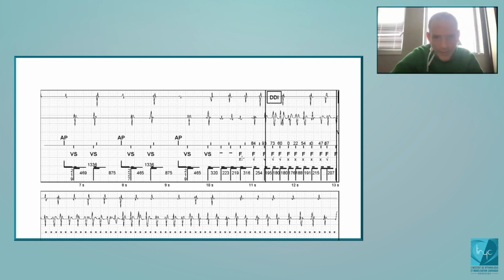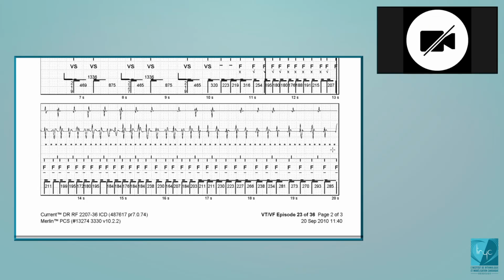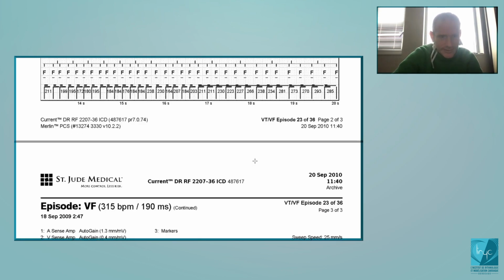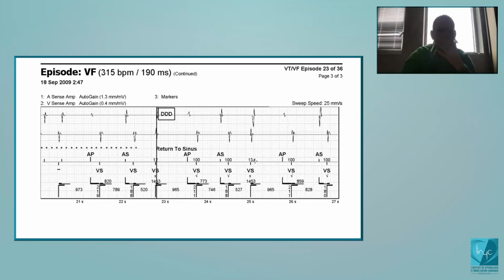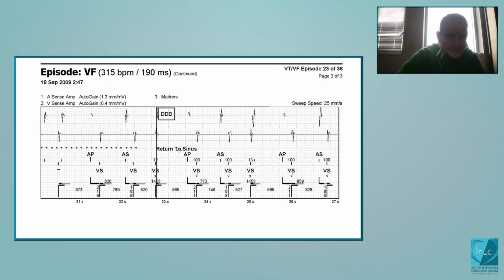Okay, so if we come back to the counters, detection of the VF. So what happens then? Then we see that the device is charging. Yes, you see the little stars here explaining that you are charging the capacitors: diagnosis of VF, charge of the capacitors. And then what happens? And then we have spontaneous reduction. Yes, there is a spontaneous reduction without delivery of any shock.